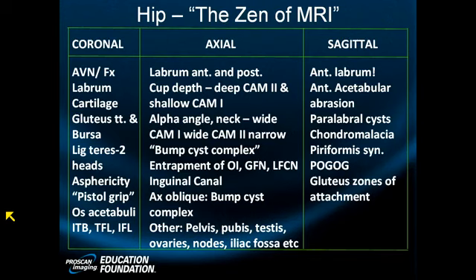We've got asphericity. We've got a shallow cup. Look at the depth of that cup compared to the size of that head. We were right. The patient does have DDH. They do have a shallow cup. They do have a bump. They do have asphericity. They do have lack of tapering. They do have a complex labral tear. They do have secondary arthrosis.